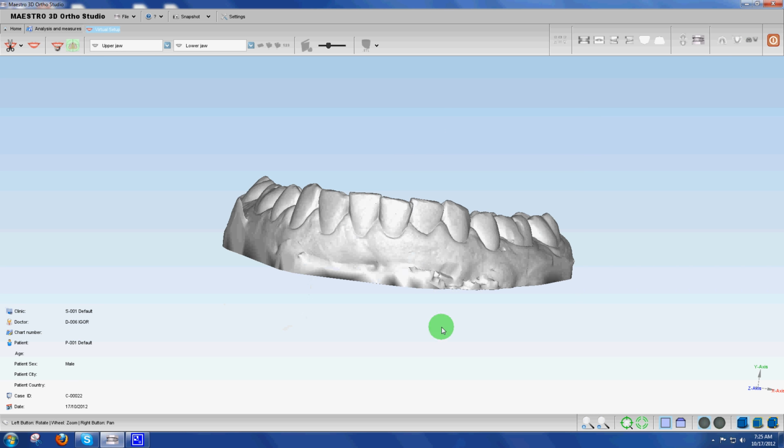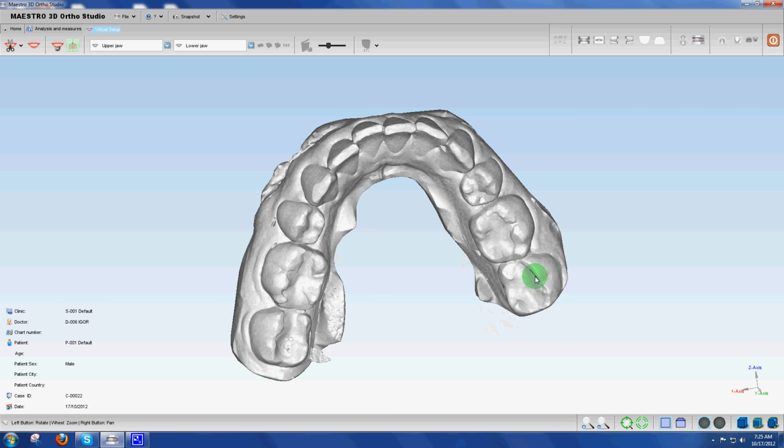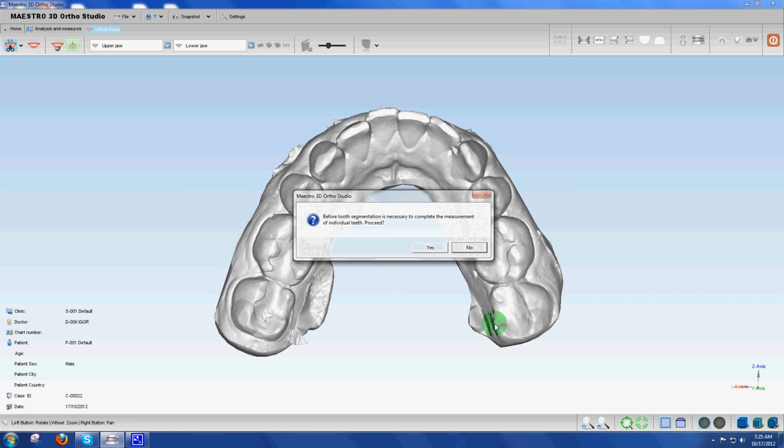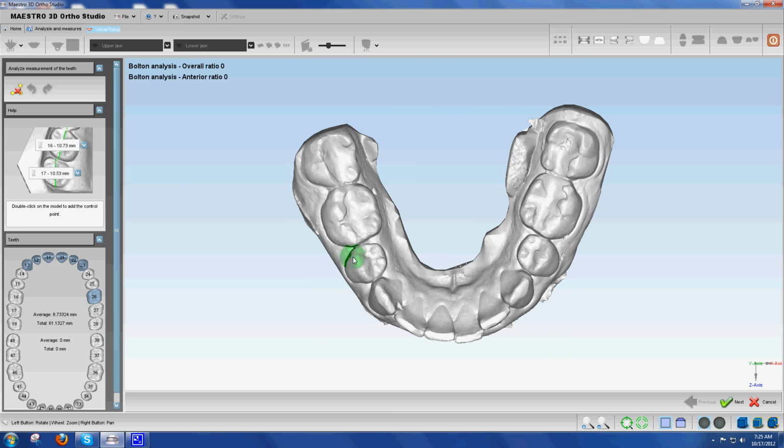Let's hop to the lower, and essentially, let's see what's happening here. My intent is to define the four incisors for the benefit of the reset, 2 canines, and the molar. Kind of a very similar scenario to what we had on the upper. So let's proceed with our plan. We're going to define the first molar, and that happens to be tooth number 4-6, while the computer thinks it's 4-8. So we're going to correct that. We're going to skip one and head for the canine.